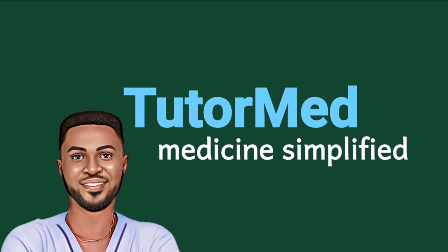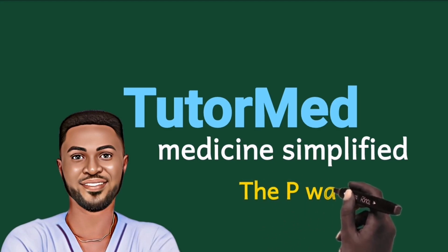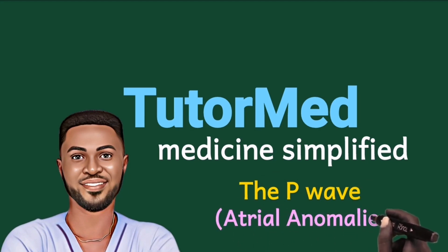And so this is the third video in our ECG interpretation series, and in this video we will discuss the P wave and how to identify atrial anomalies like right atrial enlargement and left atrial enlargement.